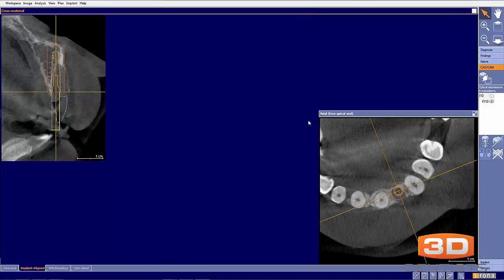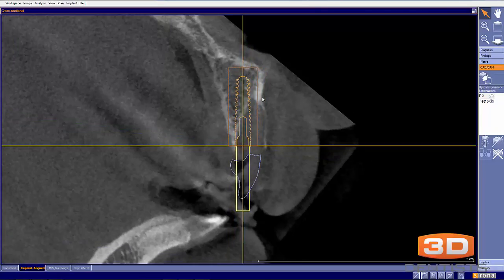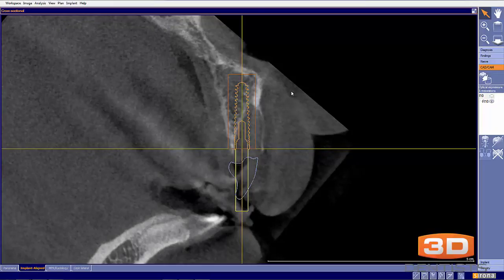Now, the other thing that I do notice here is, I'm a big proponent of screw retained restorations, but this is too thin of a buccal area here, especially given how much space we have right here. So I would probably go ahead and err on the side of that. And then honestly, because of the location of this, look at a non-screw retained restoration, maybe a cemented restoration, or if I were a Nobel user, the angulated screw channel.